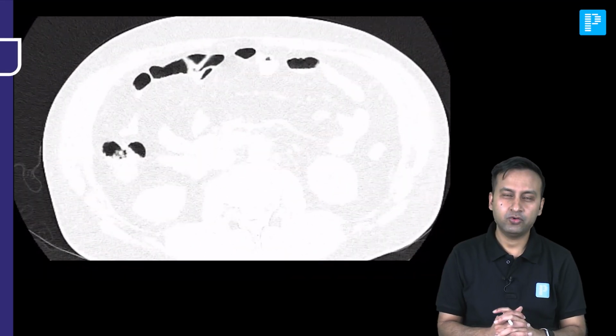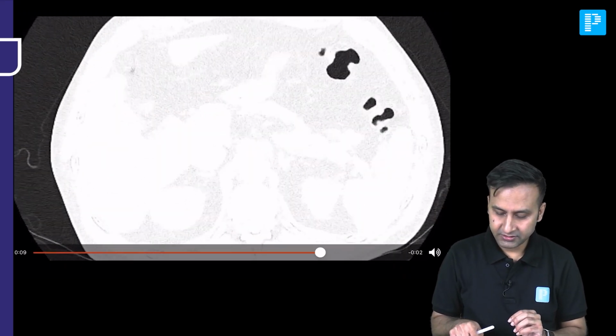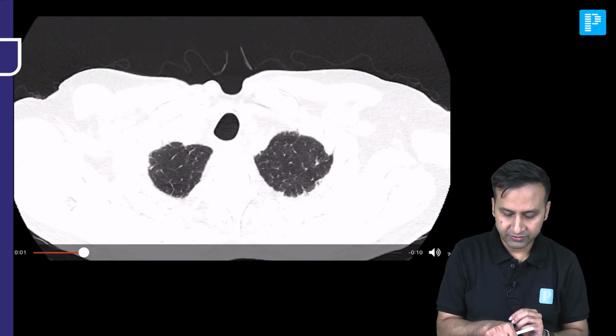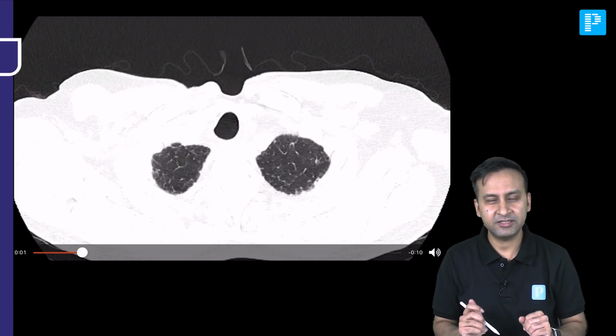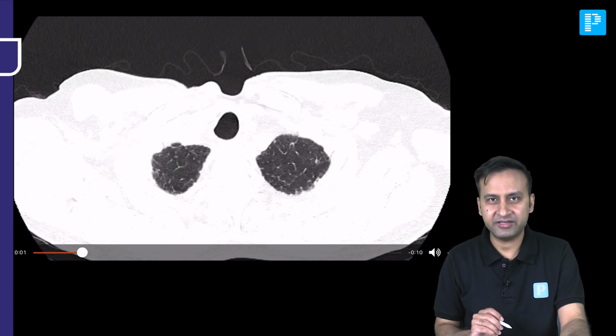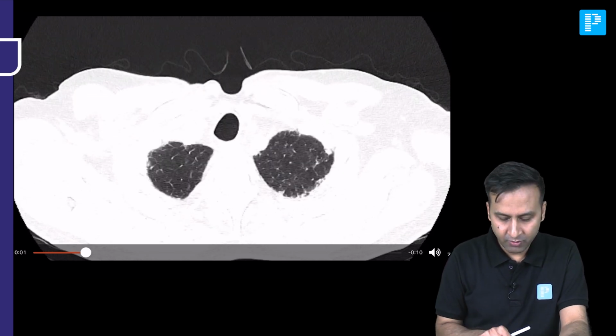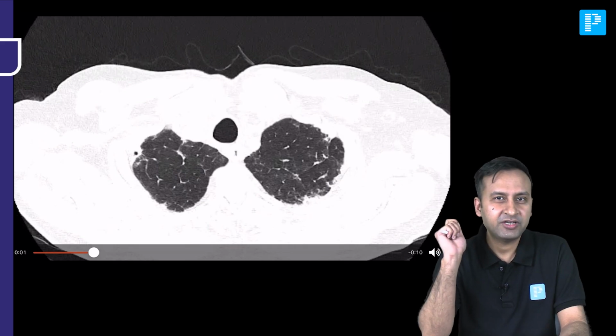So I think by now you might have all seen this case in complete totality. Now let me just show you the important observations on this cine image, and then we'll be looking at some of the representative still images from the case as well. So when I'm talking about the apices, do you see any abnormality? Remember our discussion on abnormal pathologies or in ILDs.